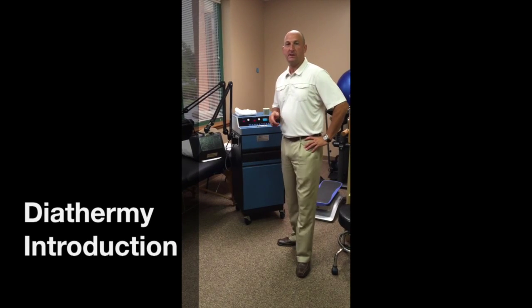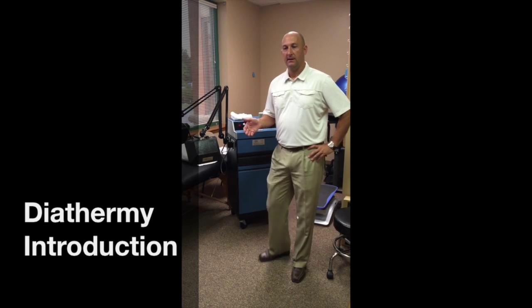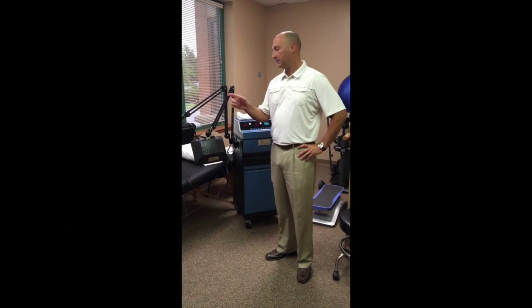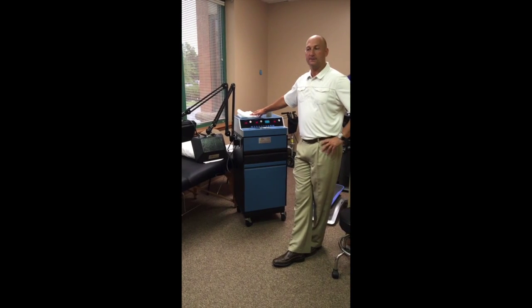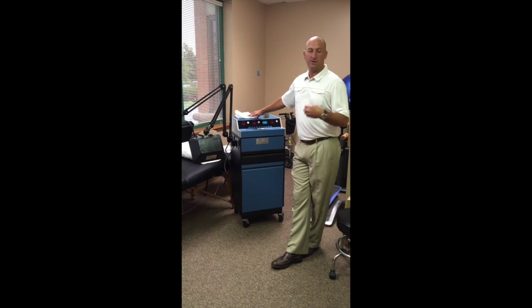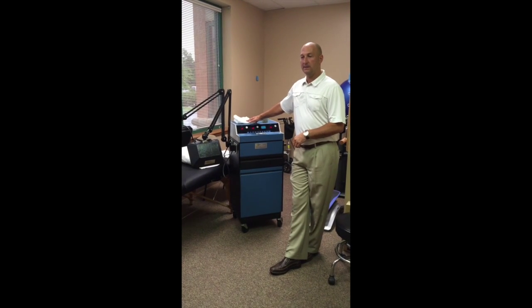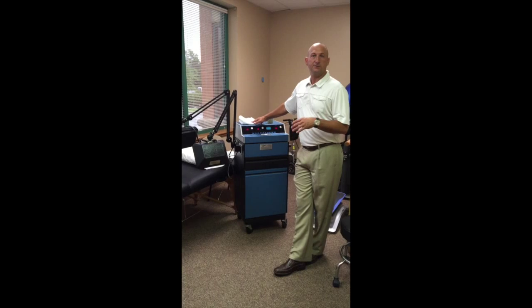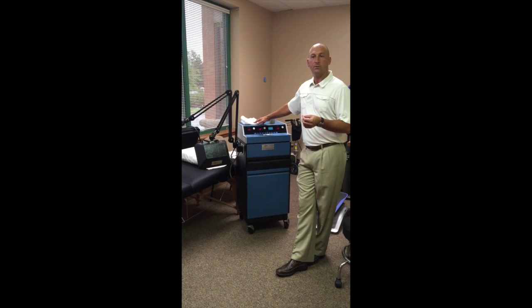So today we're going to be talking about shortwave diathermy, and we have two units here today. I will not be able to bring the bigger unit into the lab, so I'm going to introduce it today, kind of explain the difference, and then we'll also talk about some of the laws that govern the use of shortwave diathermy.